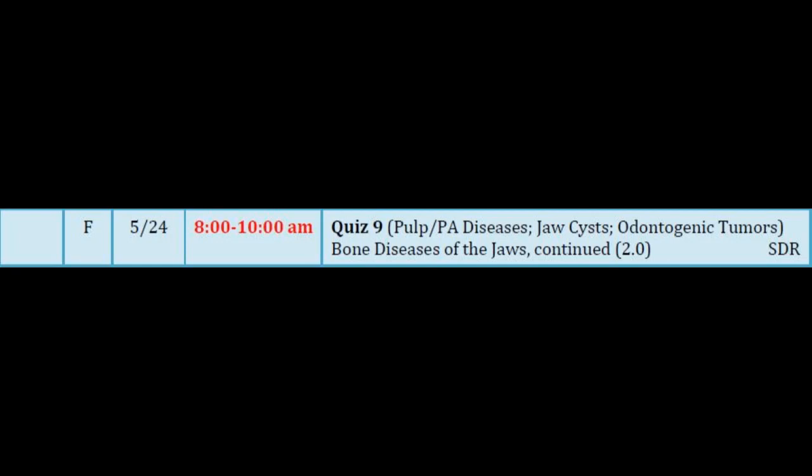This is a beautiful, huge ossifying fibroma. I don't know why anybody lets their lesions get this big. This is an occlusal radiograph, but I like to show it for two reasons. One, see how the opacities throughout do not look like trabeculae. Therefore, they have to be produced by the lesion, and that makes it mixed, and they're throughout. So that means it's probably not odontogenic. We're working with a lesion of bone origin. See how you think about it?